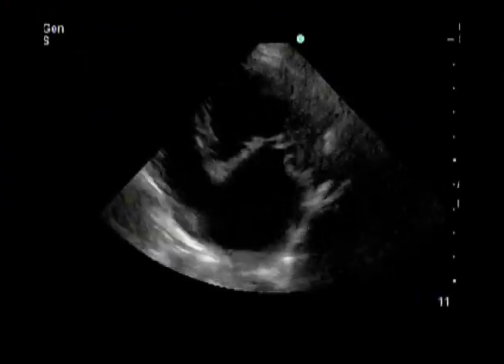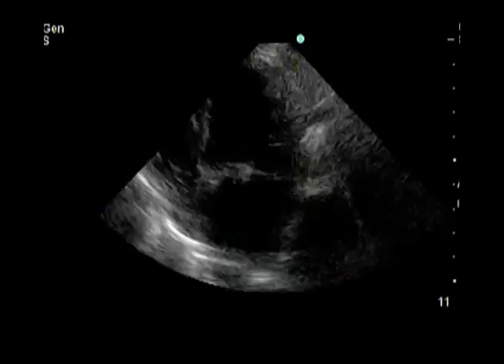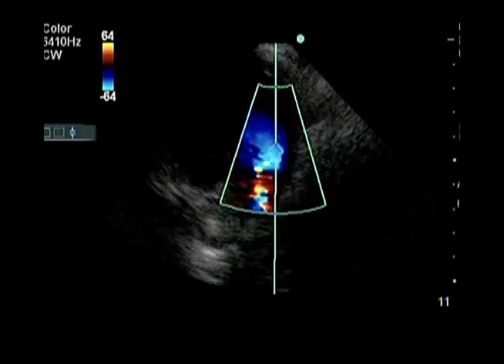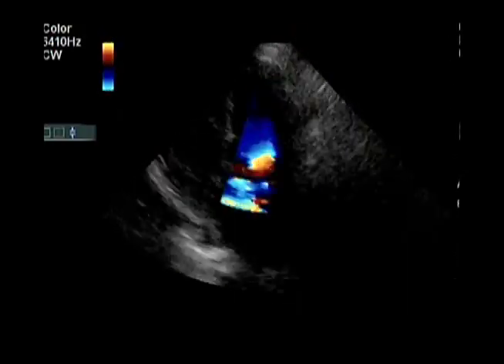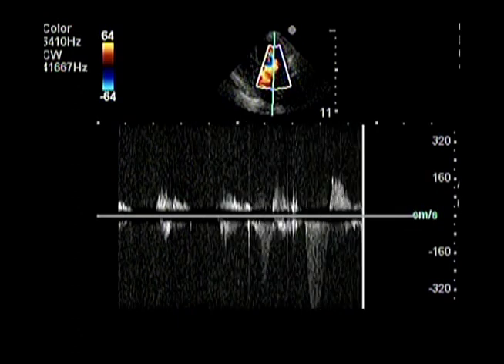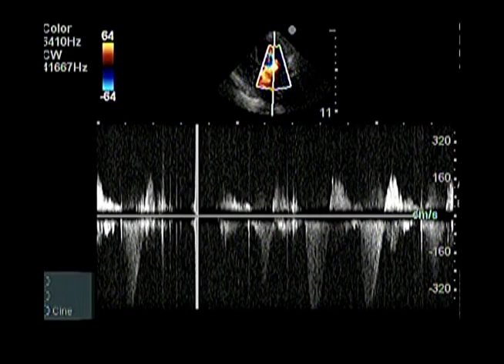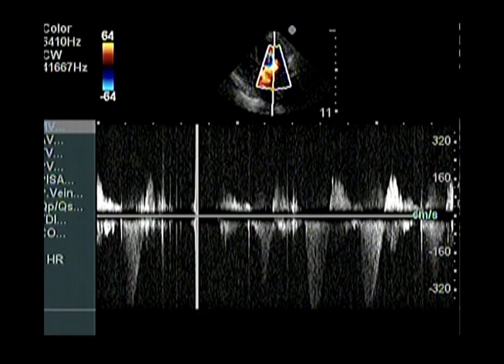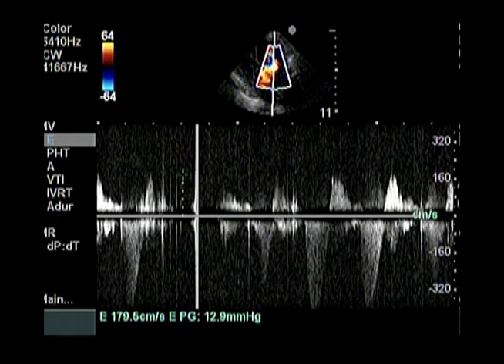In some cases of current severe congestive heart failure, pulsed-wave Doppler may top out and show excessive but inaccurate maximum flow of the mitral E-wave. Continuous wave Doppler may be needed to accurately measure a severely elevated maximum E-wave forward flow through the mitral valve.